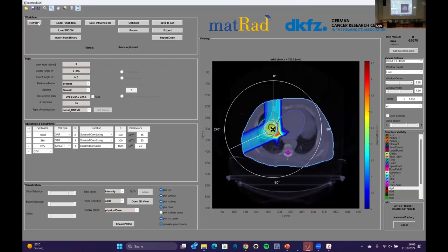Yes, it was clicking refresh. Okay, so this is basically our dose problem. Now I have changed the window, so this is really a severe hotspot. Remember, we planned for 3 gray, and now we have 5 gray in this region. It's really severe. It accumulates in this one spot where suddenly there is tissue again, where spots that went to lung now go to tissue. So this can have very unintuitive effects that you don't capture or think about manually.